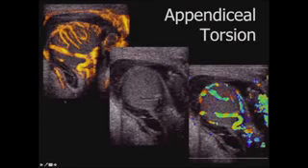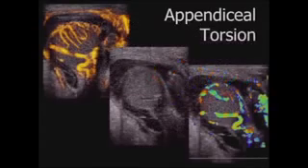So here's a case that I missed. I thought this was going to be a detorsion event of the testis. There was tremendous hyperemia and inflammatory changes, and I lost a bet to my urologist. This child also went to the operating room just because his pain was not going away as expected, and probably what this was a little torsed appendage right here.